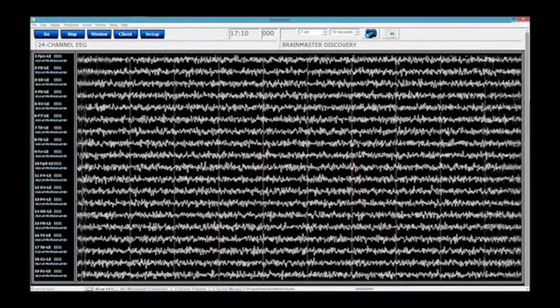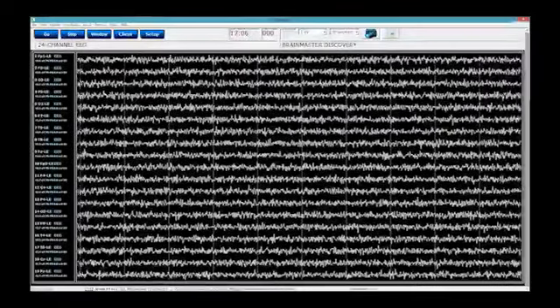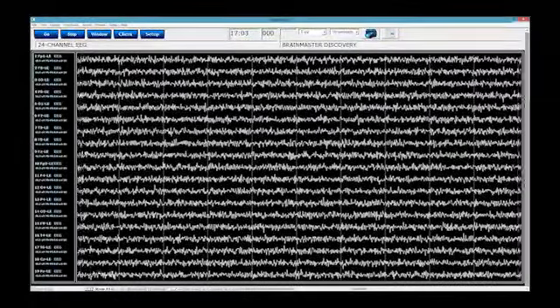So this is a brief overview of 19-channel Z-scores from a standard protocol that we had right off the bat.